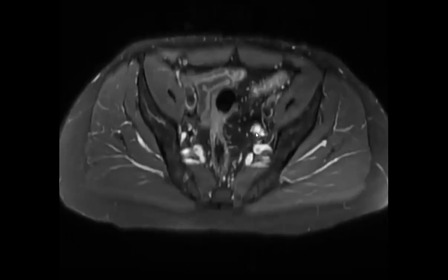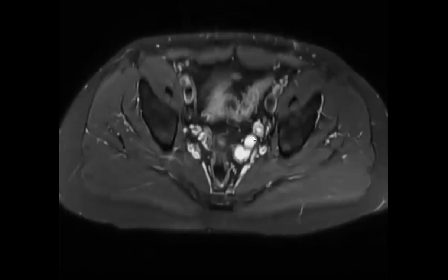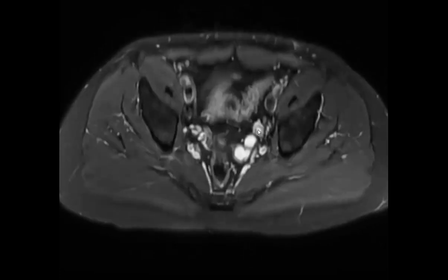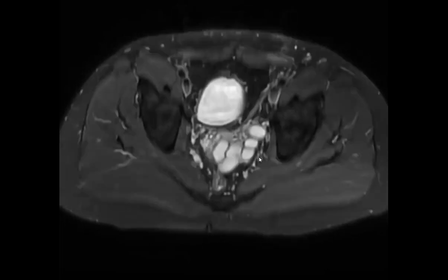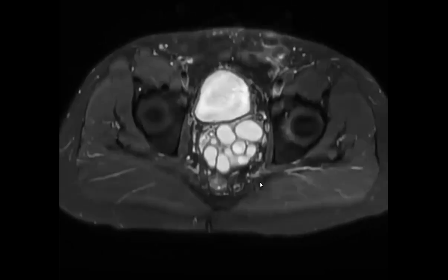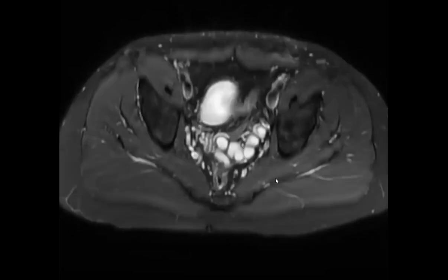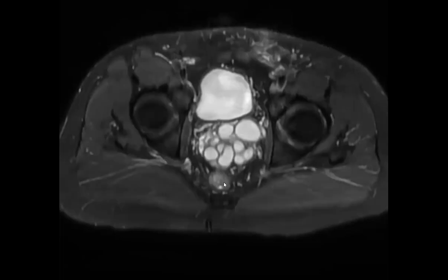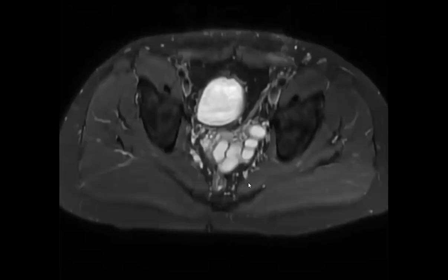And then the other interesting thing is there was this tubular, fluid-filled thing inserting on the seminal vesicle. And so we think that was actually the remnant ureter ectopically inserting on the seminal vesicle. Yeah, so they call it Zinner syndrome. Usually it's incidental. It can lead to decreased fertility because of the ejaculatory duct obstruction, and it can lead to symptoms. So in younger patients with symptoms, they might resect this part of it, but usually they just treat it conservatively.